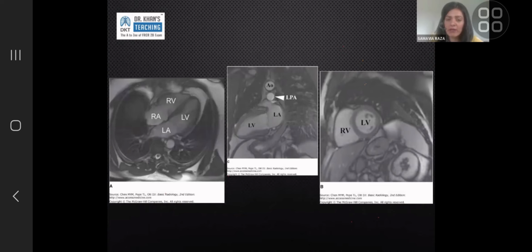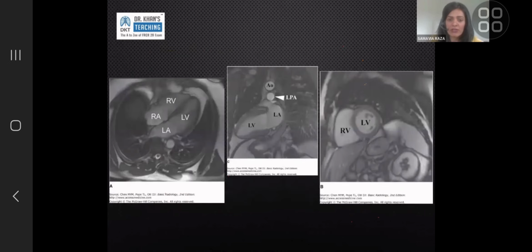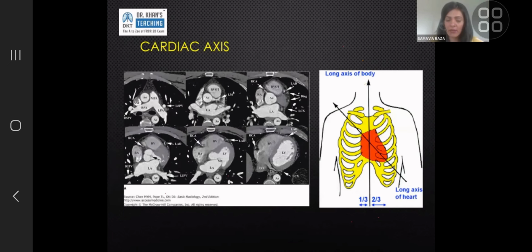These images on MR are acquired along the axis of the heart, but the CT is not. So the images you would use to accurately say this chamber is this much enlarged, you can do on MR and not on CT, unless you then reformat those CT images along the axis of the heart. The views that you see in cardiac MR are the views that you see in echo, and you can create those views on CT as well, but you have to create them manually. Or if you have cardiac software, it may sometimes generate them for you, but they almost always need tweaking.